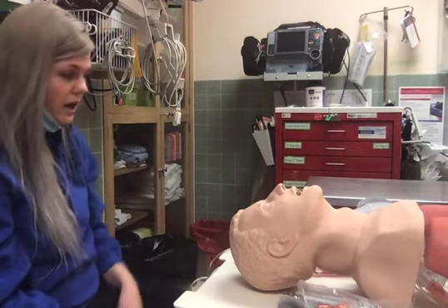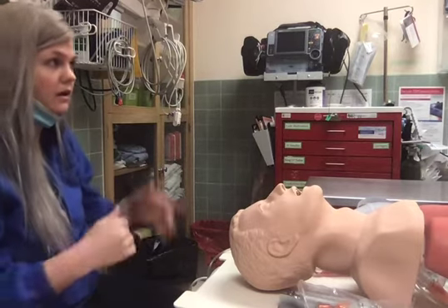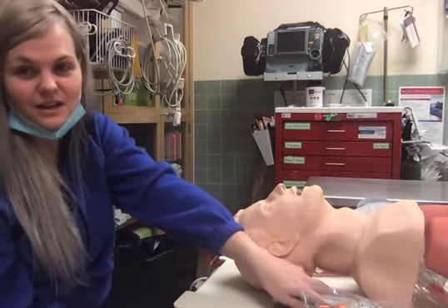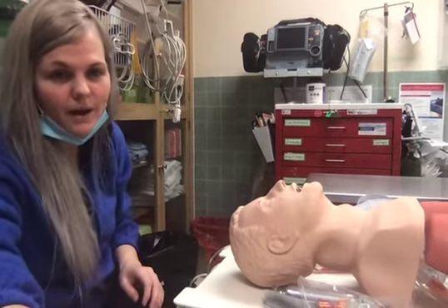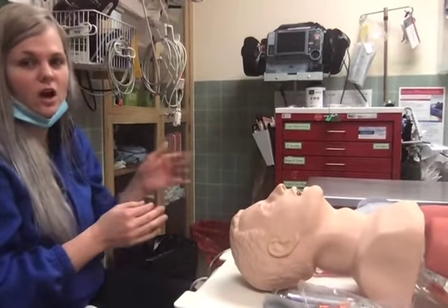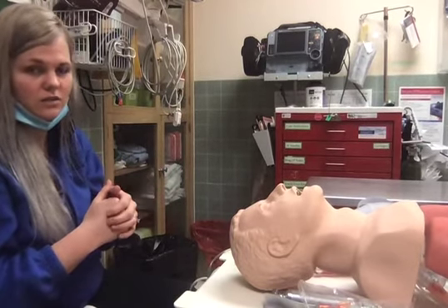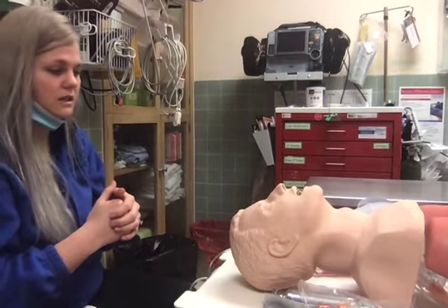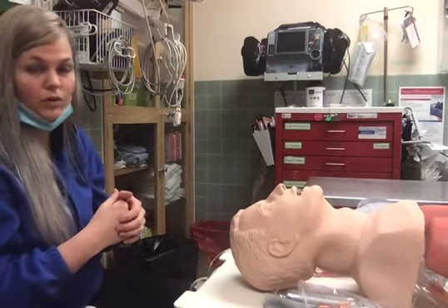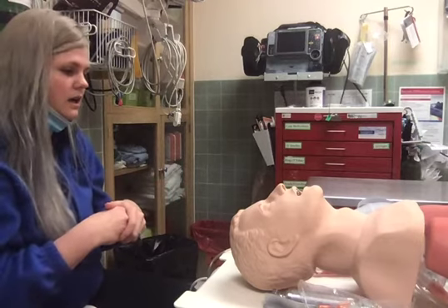intervention there. I don't have a BiPAP mask here because we do not use that in this ER. We will be using it shortly, which I'm very excited about, but I utilized that on the helicopter. And so BiPAP is more for ventilation support rather than oxygenation. So if you have somebody that's really failing on both the inhalation and exhalation fronts, you can utilize this. We've been using it a lot in COVID patients just because they need that constant recruitment of the alveoli to keep those shunts away, if you would say that.